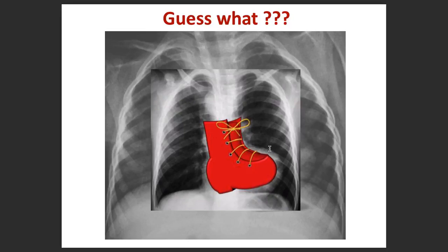What do you see? So you notice this. So this is more of an upturned cardiac apex, right? So you notice right ventricular hypertrophy. It's not always present, but in the majority of the patients, up to two-thirds of the patients with TOF, will be having this. So the narrow upper part of the boot results from a small or absent main pulmonary artery, partly caused by a narrow infundibulum and hypoplastic main pulmonary artery.